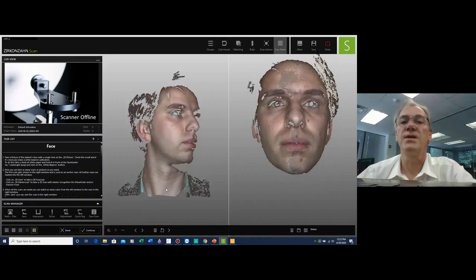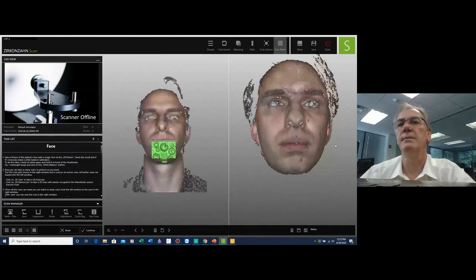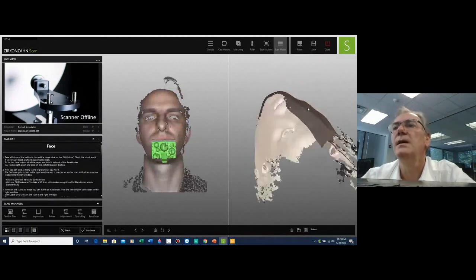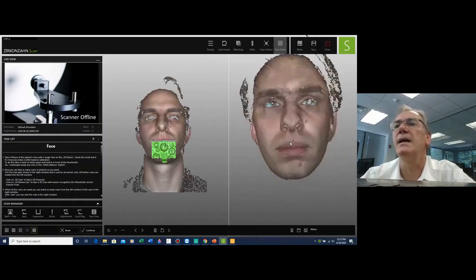We'll go look for the second 45-degree left, clean it out, and move forward with the shift. We need to take the minus away, left click, and we can highlight the area where we would like the matching to focus. And again, dot on the left side, left side, and right side, and the image moves in and we get it matched. Take a look and we see that there are no overexposures of the images. I'm pretty happy with what I have.